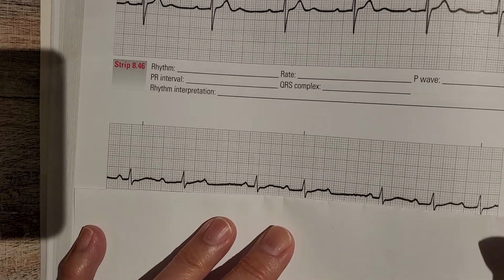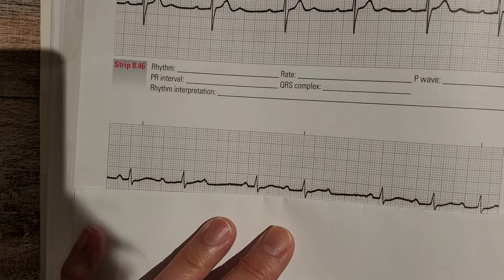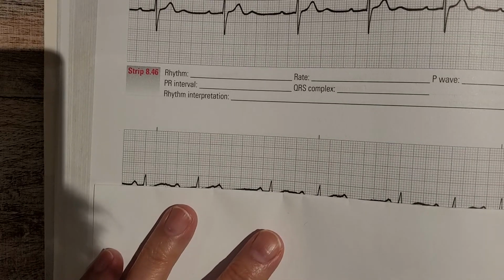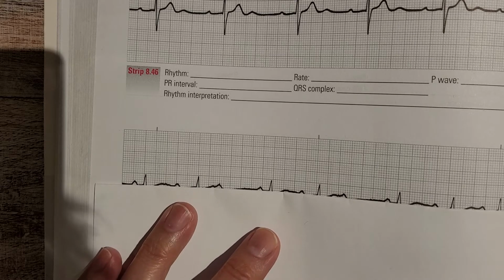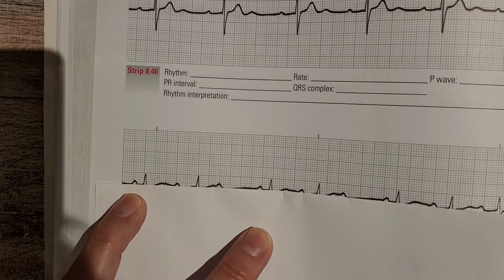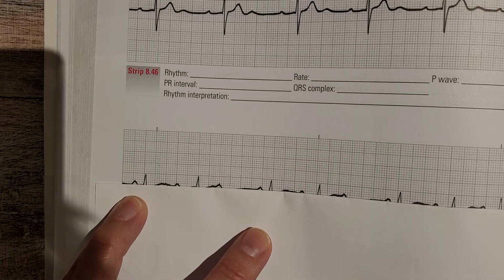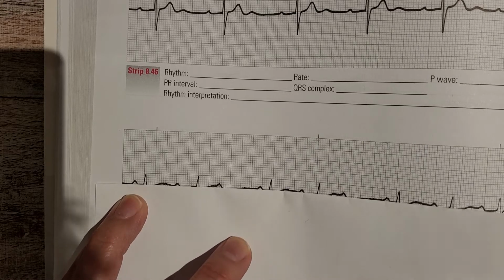But what I'm going to do is look at the P waves and mark them out on the edge of my piece of paper. And it's okay if you're not seeing all the P waves and you miss a few, like I said in another video I posted before. Don't worry about it, because we will map through and find them.